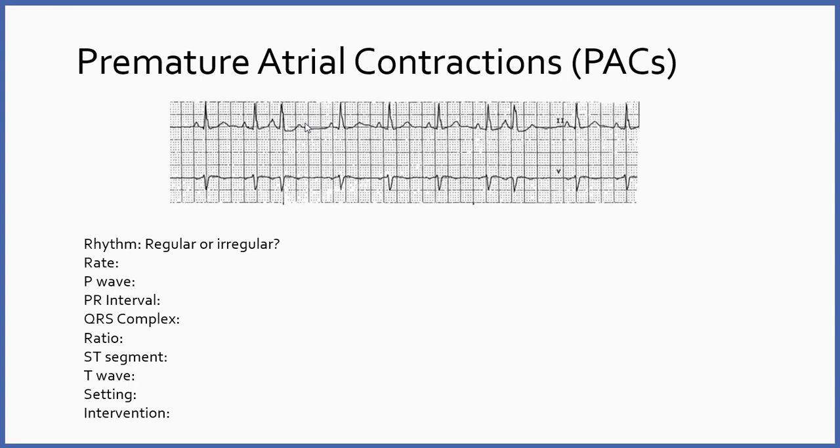The other thing I wanted to mention is the ST segment depression here. Now, you don't usually see this, and we only see the ST segment depression in the 2 early beats. This is actually not something that's real common with PACs. Usually with PACs, we still keep an isoelectric baseline on our ST segment.